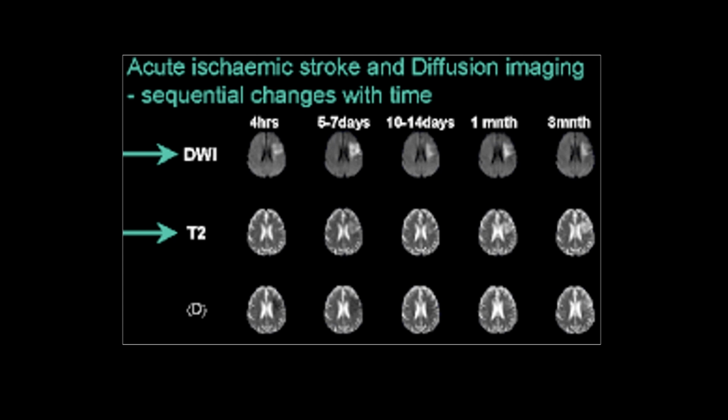This slide is extremely important not for helping the diagnosis itself, but for conveying the timing. Time is everything in life. Therefore, time is brain. We need to know when the ischemic or hemorrhagic stroke happened. In the first line, we are going to analyze the diffusion-weighted image. In the last, the ADC, the apparent diffusion coefficient map. And in the middle, we are going to see the T2, that is similar to FLAIR apart from the cerebrospinal fluid, and is important to give a morphological idea of a functional sequence like diffusion-weighted image.